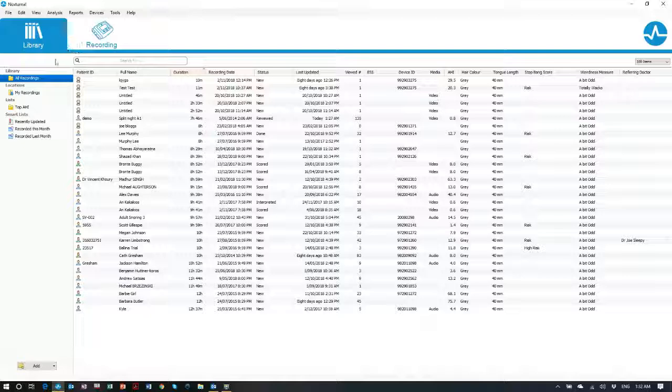We can then open a study. Let's do that. So let's have a look at which one of these I've viewed most.